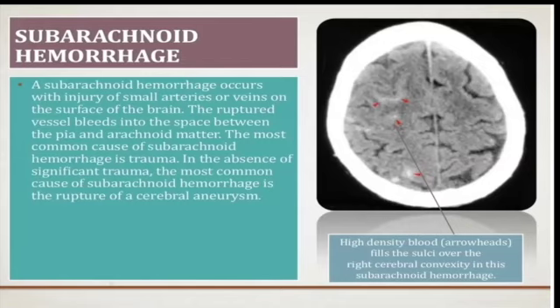Please order a CT for that patient and start comparing the sulci on both sides, okay? Now, subarachnoid hemorrhage, again, is just a term that we use for any bleeding that's between the pia and the arachnoid matter. However, we just need to compare the sulci on both sides. And now this image here is just very easy to compare. Now you should compare these darker sulci, and then look at the other side. We have them filled with white material.